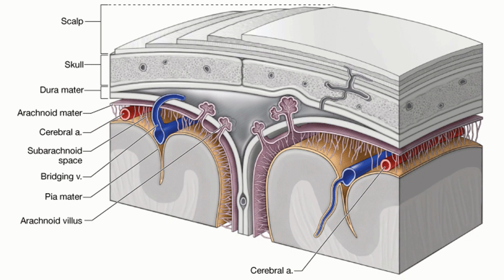So we cannot see the meninges in CT except under two circumstances. One is where they form specialized structures. We have the dural structures, the falx cerebri, the falx cerebelli, and the tentorium cerebelli, all three of which are visible in CT. Or in pathological conditions, say there is an epidural hematoma, then we would be able to see the outlines of the dura.